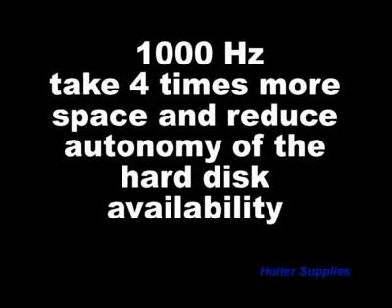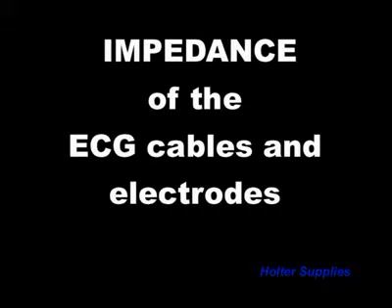Recording at 1000 Hz gives a very accurate signal, but it consumes 4 times more space than recording at 250 Hz and reduces the autonomy of the recorder or the hard disk availability. It is strongly recommended for recording patients with a pacemaker or for specific tests.